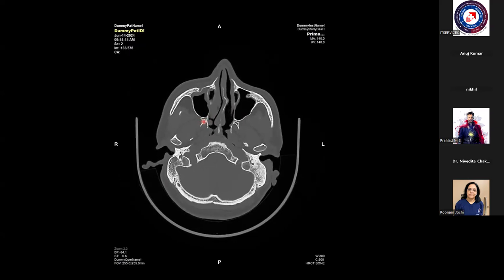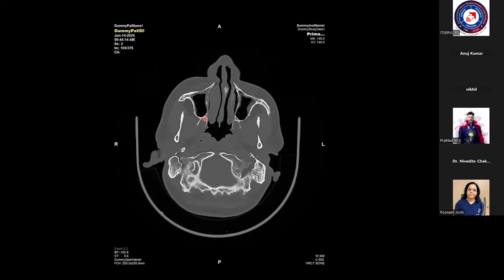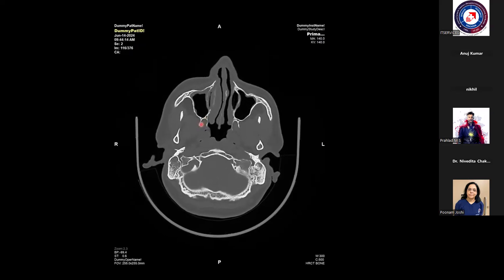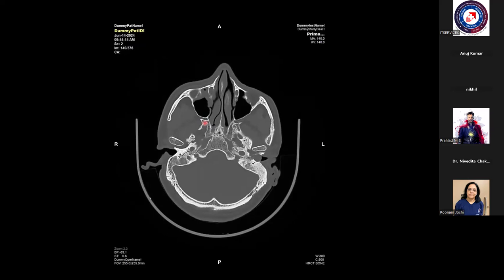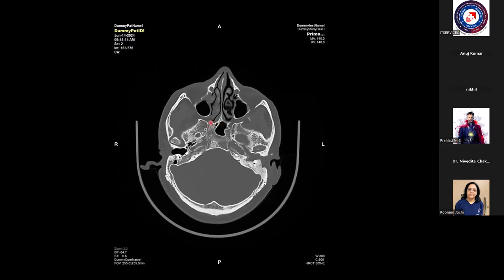So this is the pterygopalatine fossa. So inferiorly, this pterygopalatine fossa communicates with the greater palatine canal, or the greater and lesser palatine canals. Clear? Now, as we go above, now focus on this canal specifically. Now you can see this canal is opening posteriorly over here as well as posteromedially.